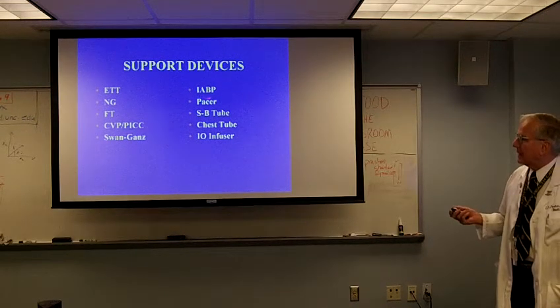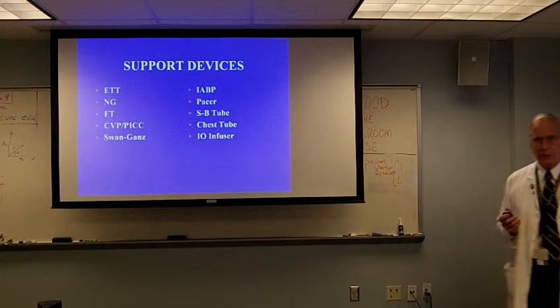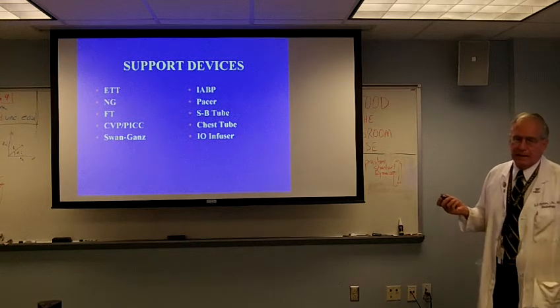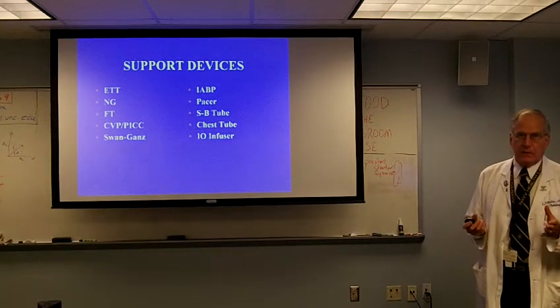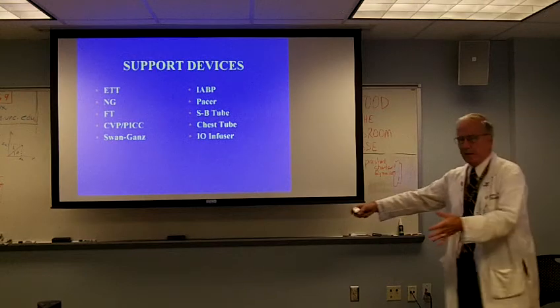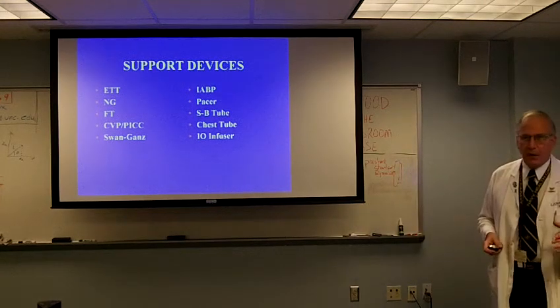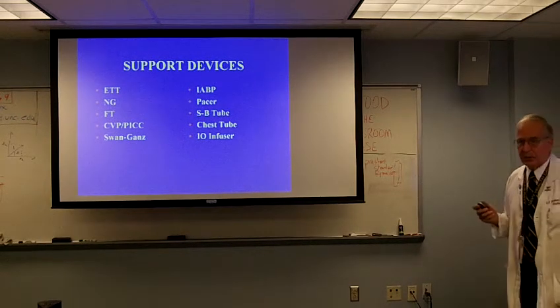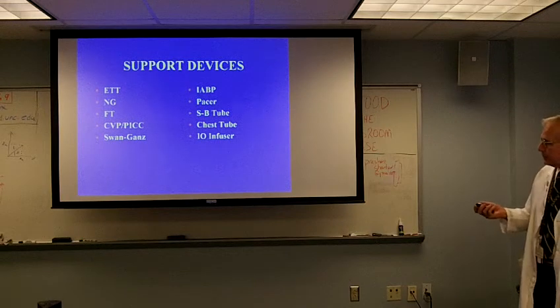This is something you may not have encountered before, the intra-aortic balloon pump. And I'll show you examples of these, and we'll talk about what that does and why it's useful. The problem is the clinicians know the patient has the intra-aortic balloon pump because there's this god-awful thing sitting next to the patient's bed. But when you're looking at the radiograph, all you see is a little teeny tiny radiopaque marker at the end of the balloon pump. And if it's not inflated, it can get lost in all the clutter from his or her surgery.